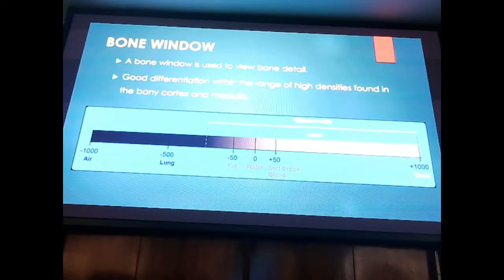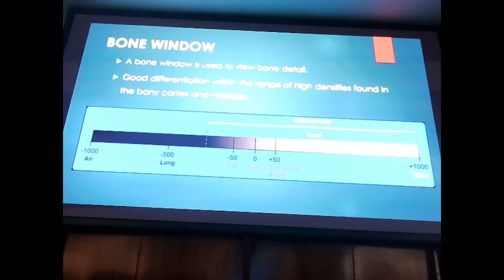So for us, in CT scan we use mainly a bone window to study anatomy. And if you want to see the extent of disease, then we ask for a soft tissue window. Like especially in a case like AFRS, then we ask for a soft tissue window.